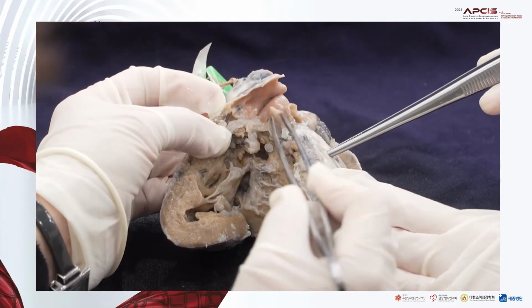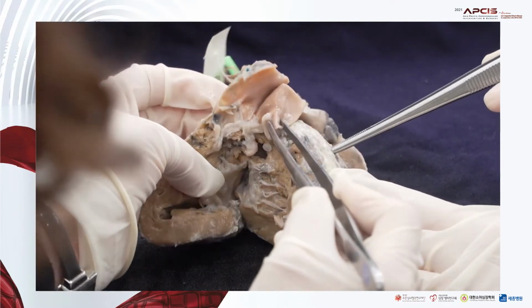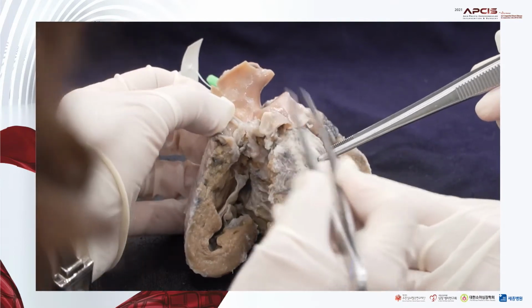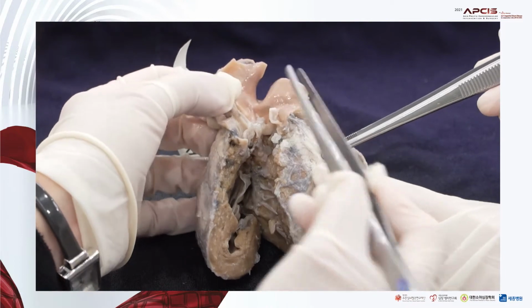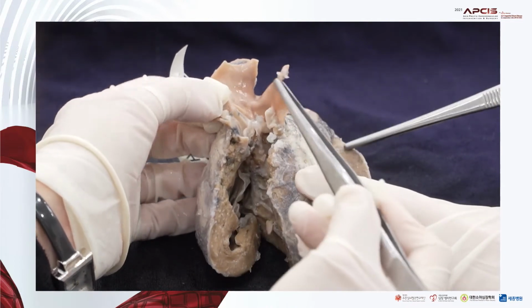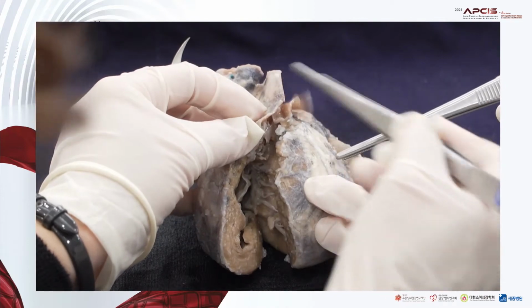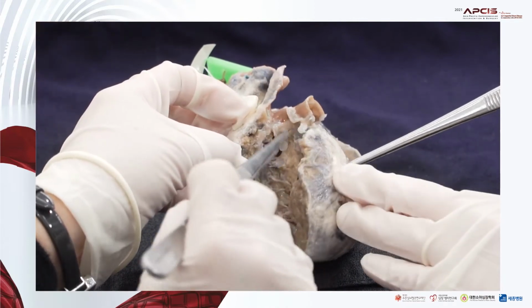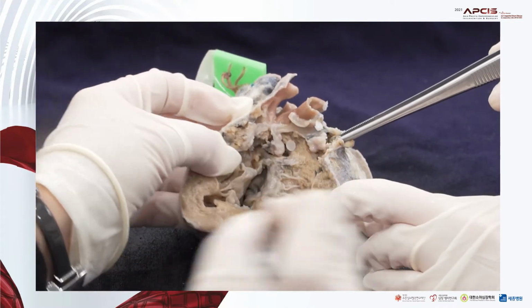So this one also had a bicuspid pulmonary valve. But in contrast to the previous one, this one shows post-stenotic dilatation of the pulmonary trunk, I think. Yeah. So the main pulmonary trunk itself is sizable, but the subpulmonic area had stenosis before.